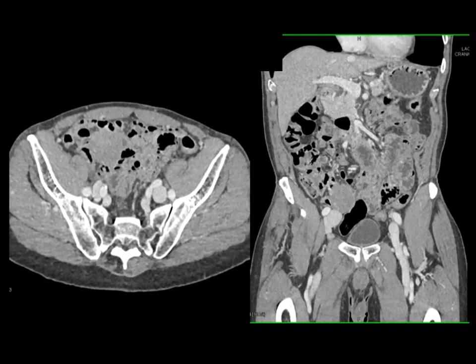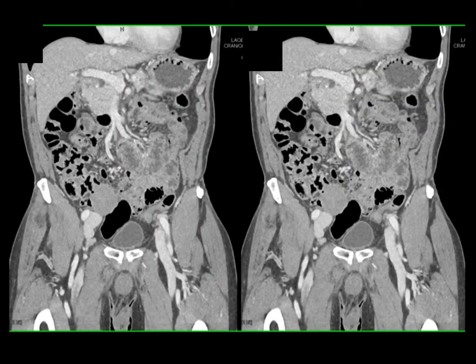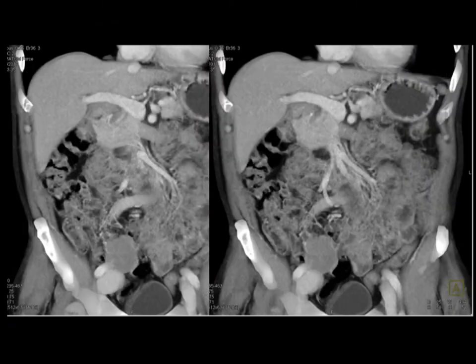You might have also considered a missed appendiceal abscess, but it was a surgical case. Again, another example showing that. And then here's an example just showing you the 3D mapping of that tumor.